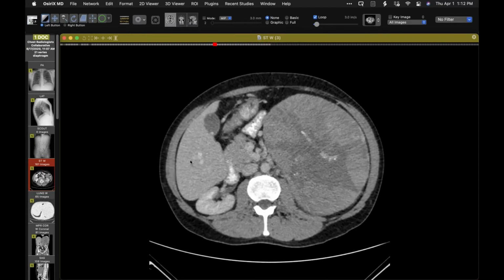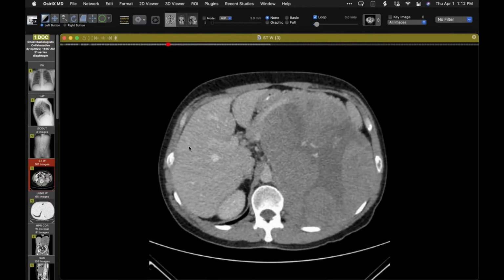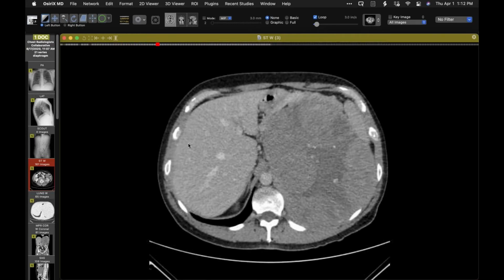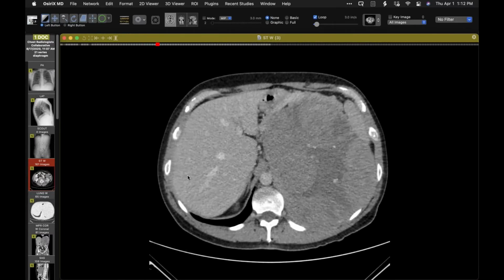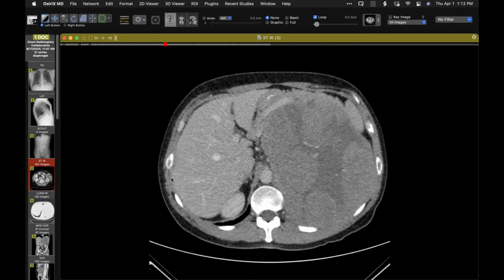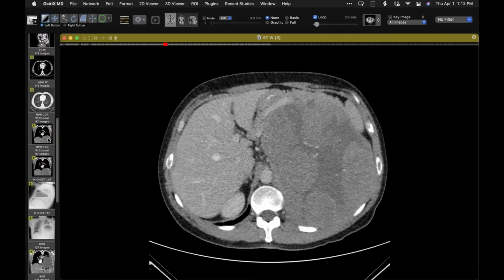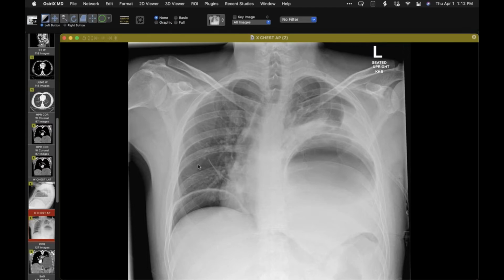Interestingly, initially after they removed this and evaluated it, they weren't really sure what tumor it was, but eventually the pathologists settled on a large ganglioneuroma for this lesion. So that was removed, and the op notes described an uneventful procedure for removal of it. And here is chest radiography on post-op day 1, and you can see the patient is not intubated, not in the ICU with tubes or anything, and here is the frontal and lateral.